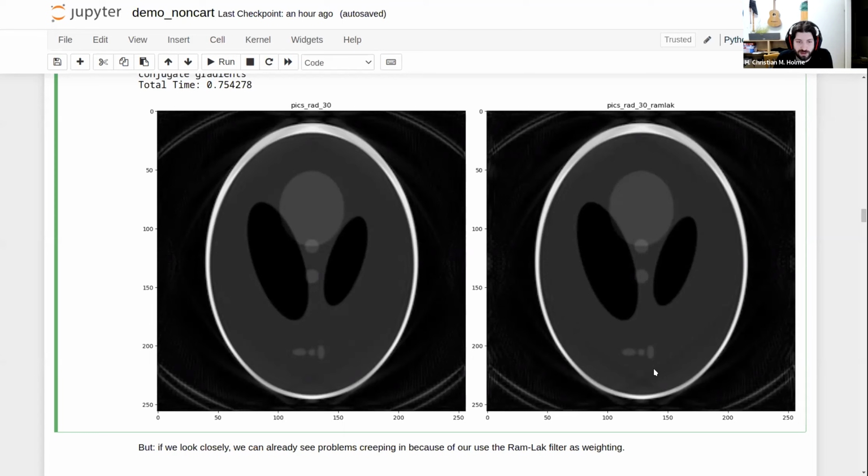This might get worse. So it's actually not noise optimal to use the Ramlak filter in this case, but as we heard before, in 3D imaging, you sometimes just can't get any good results using the inverse NUFFT, or the same problem with Pix might appear. Then it's much preferable to have this be a bit less noise optimal than to just have no good result at all. But that was just as a quick aside.